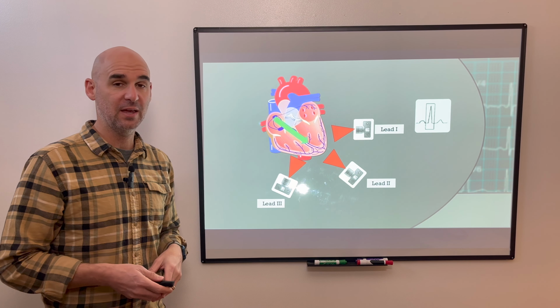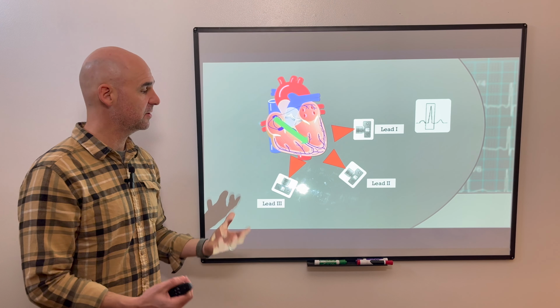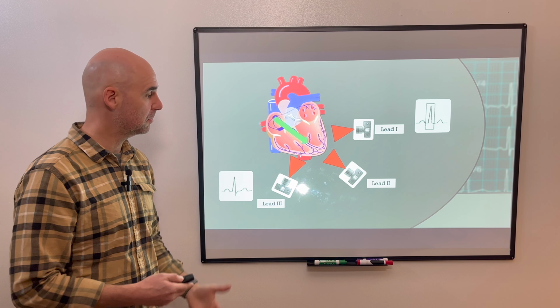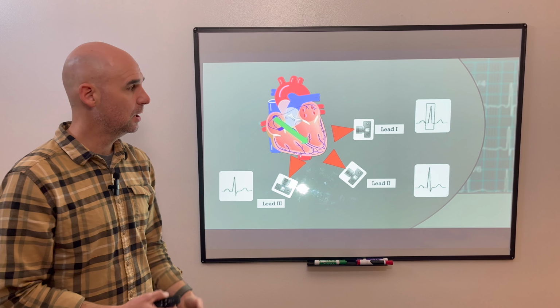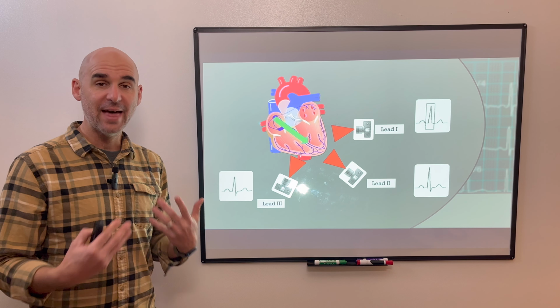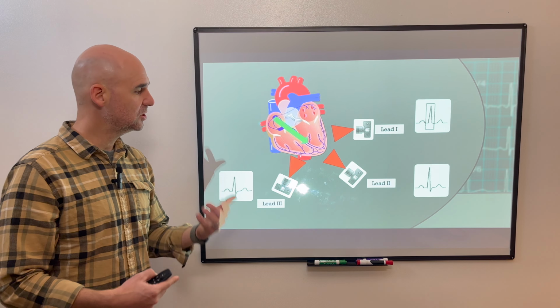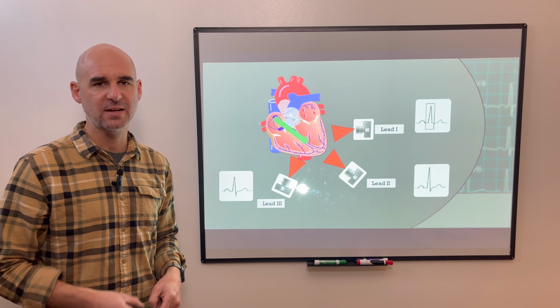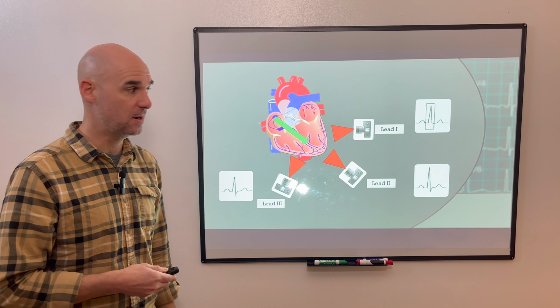It's definitely moving in the general direction of lead 2. And it's still moving in the general direction of lead 3 if you imagine them looking from directly below in a three-dimensional model. So all three of these under a normal depolarization are going to be a positive QRS, or upright. And that indicates normal axis. All right, so if leads 1, 2, and 3 all have positive QRSs, that's going to be normal axis, the same as having between 0 degrees and positive 90 degrees.